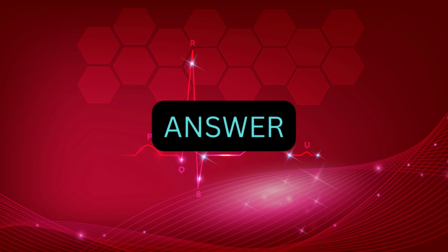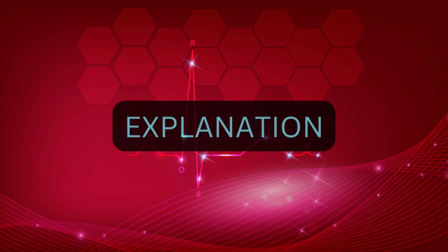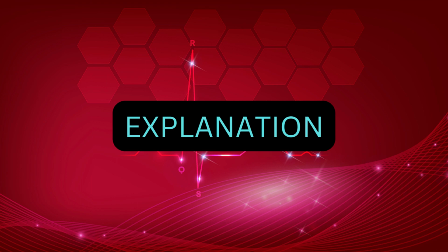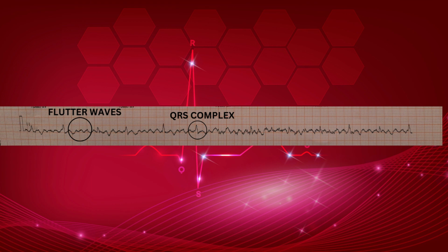The correct answer is atrial flutter. This is a form of supraventricular tachycardia with an atrial rate of 250 to 350 beats per minute. It is characterized by flutter waves or sawtooth waves on ECG. These changes are prominent in leads 2, 3, AVF, and V1.